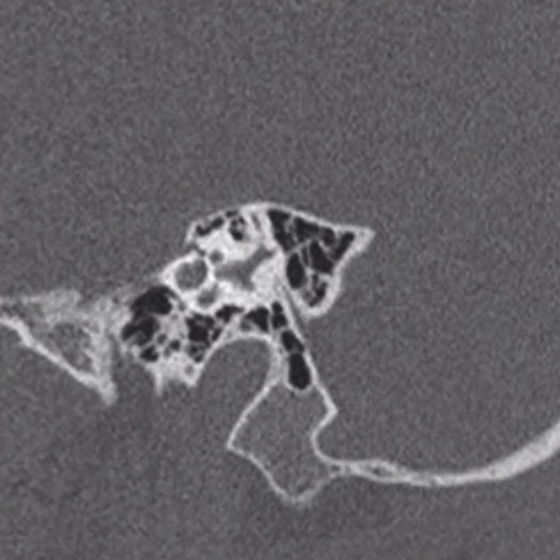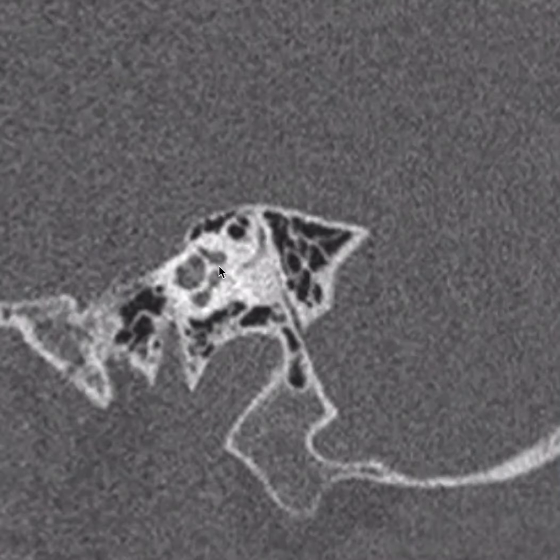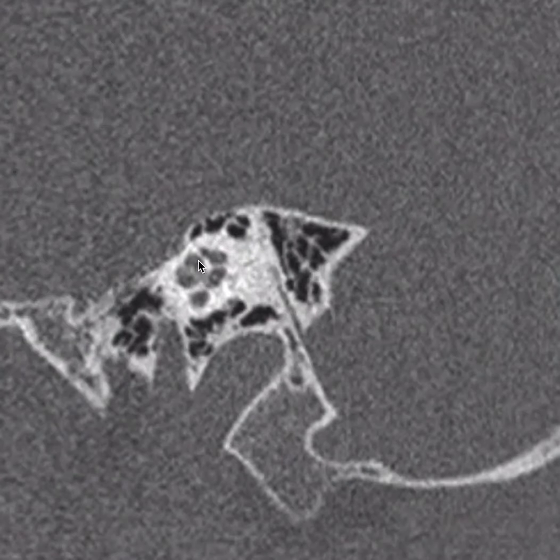So our cochlea has 3 turns. The basal turn is right here, with an impression forward right here forming the cochlear promontory. The modiolus is the bony structure in the middle. Here's our middle turn of the cochlea, and here's our apical turn up here. The modiolus allows for interscalar septa to separate each turn of the cochlea. So you have interscalar septa here between the basal and middle turns, and interscalar septa, which are harder to see, right here, between the middle and apical turns.